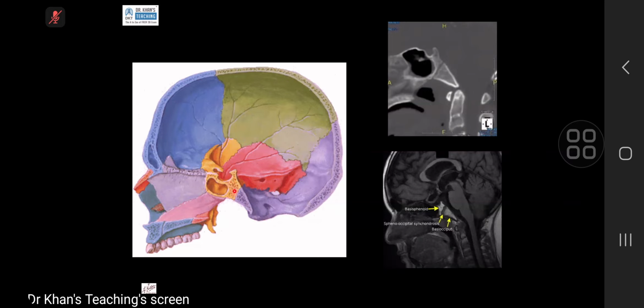So the pituitary fossa is sitting sort of on top of it. Anterior to that is the sphenoid sinus. And this is the key concept, or key orientation, which I was asking in the case which we just did. I'll come back to that. Just see here, this is the clivus; anterior to this portion will be the sphenoid sinus, and then will come the nasopharynx.